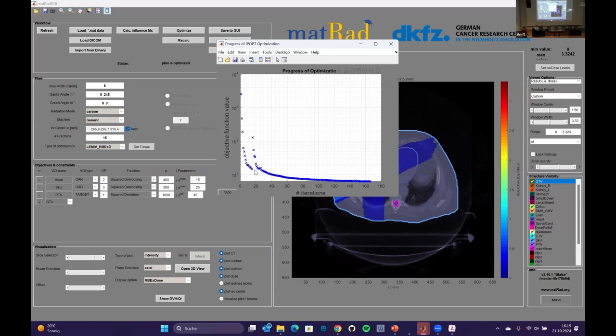So if you rescale, you might basically get sent back far away from 0, and then your objective function value spikes until it finds its way again. It's just the inner workings of the optimizer, and it's very unusual to see this if you are accustomed to, for example, conjugate gradient descent, where it reduces all the time. But here it's really just this barrier for non-zero-ness that is changed. It doesn't have any bad effects. It's just one feature of the optimizer.